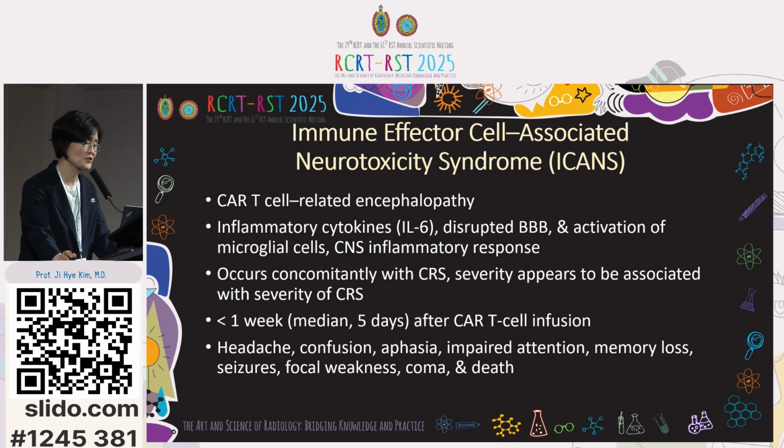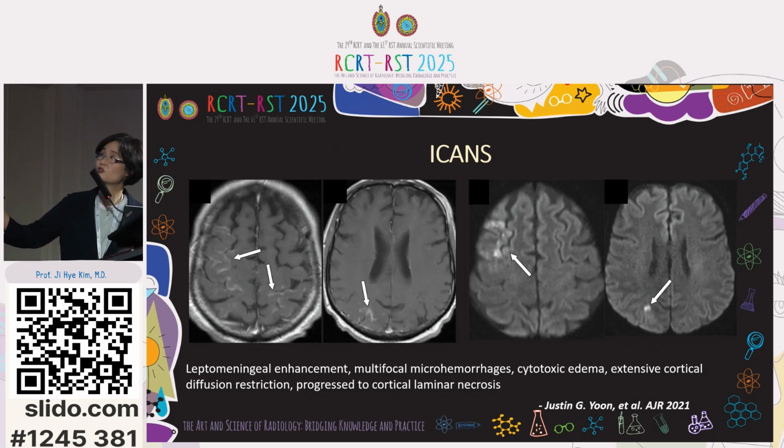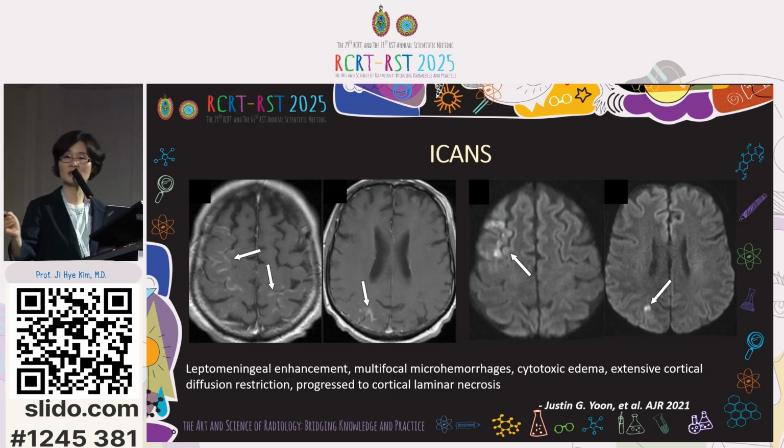The patient usually presents within a week after the CAR T cell infusion with diverse clinical symptoms. This is a reported case. We can see multiple leptomeningeal enhancement and cortical cytotoxic edema like this. And additionally, we can also see the microbleeding and the progressed cortical laminar necrosis.